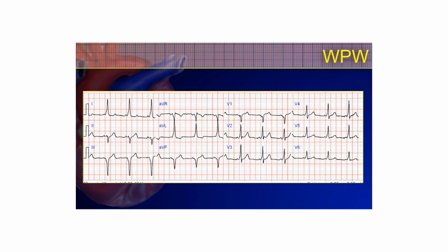So just looking at a couple examples, here's an actual 12-lead EKG of somebody who has Wolff-Parkinson-White syndrome. It's very apparent in a couple of the leads, but just looking at lead 1 from the beginning, do we see our triad that we talked about? I think you'll recognize that we do. We have a P wave before the QRS complex, but that PR interval is really short, isn't it? So you have a shortened PR interval, and then you do have that slurring upslope of the QRS complex.